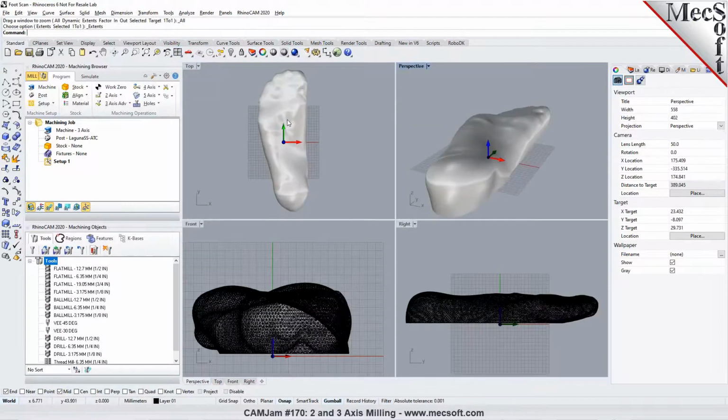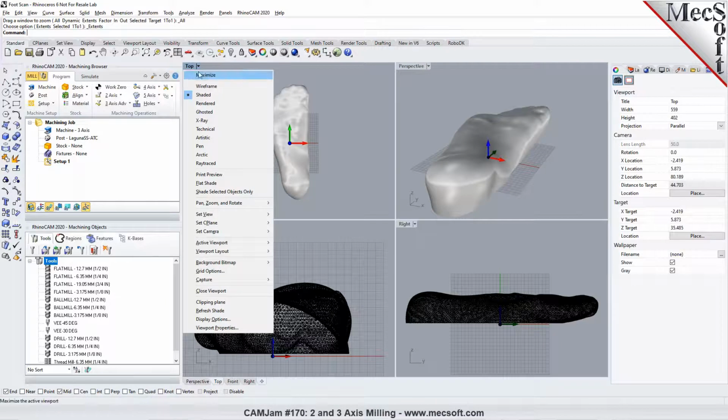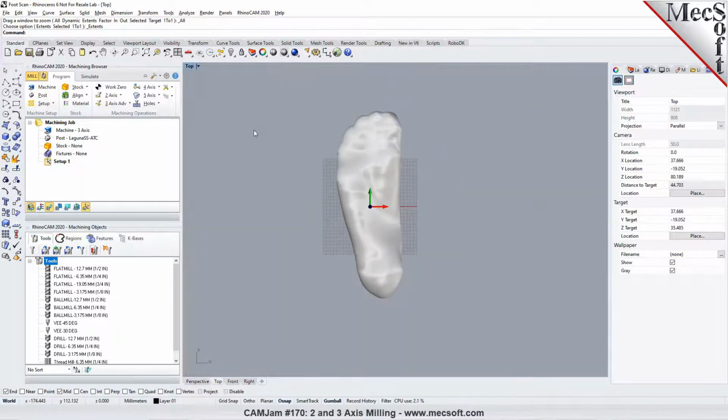So I only have the left half, so you can do the same thing for the right half as well, or one of the foot here. It could be the right side, sorry. Now you want to machine this, the workflow would be very similar. Well, here's where it gets a little tricky with that aspect of it.